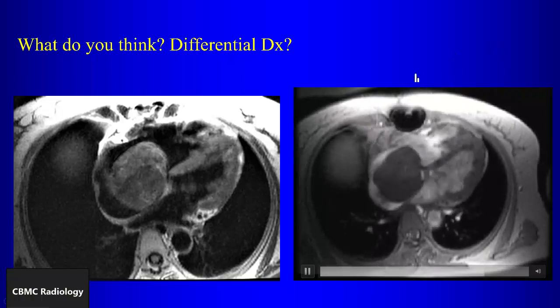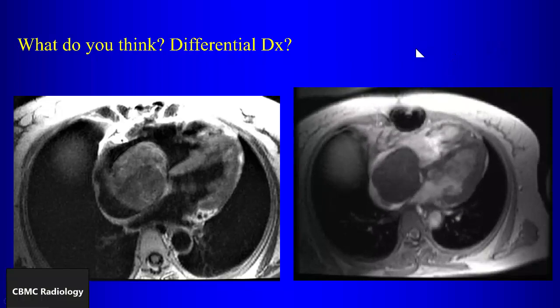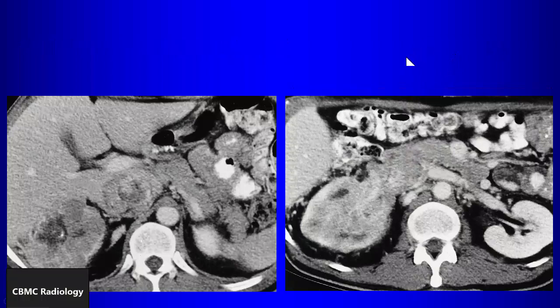But tumor also growing up into the right atrium has to be considered, and actually that's more common than myxoma, okay? And so on additional images on this patient show what? RCC. Yeah, so there's a tumor here in the kidney, so that's an RCC, and it's invading into the inferior vena cava, growing up the IVC into the right atrium.